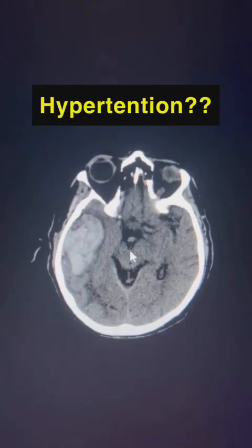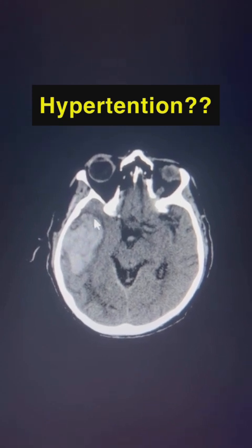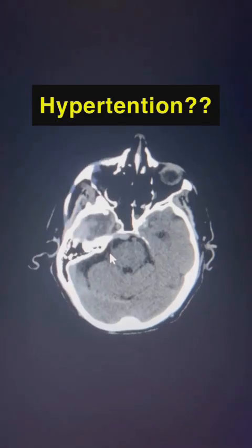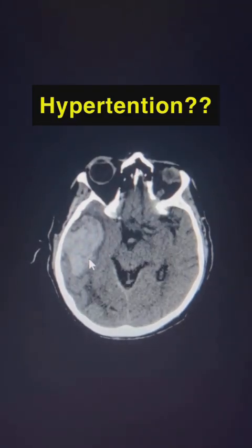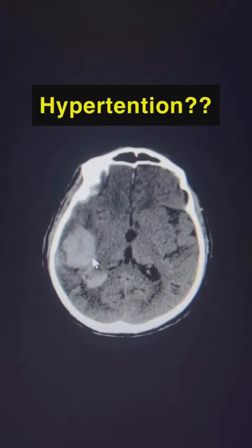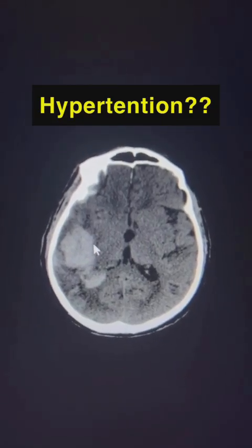We've discussed before various causes of intracranial hemorrhage and intraparenchymal hemorrhage in particular, with hypertensive and traumatic causes being very common. Now, the teaching point of this case is not here, it's in the subsequent MRI, so let's go to that.